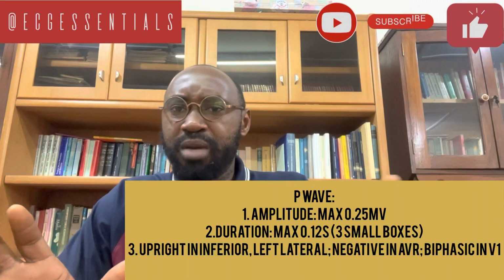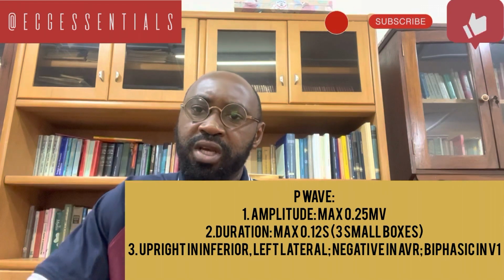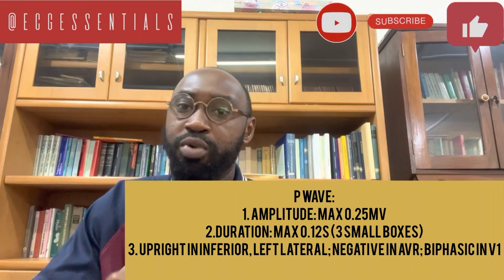All right, so a few things about the P waves help us to appreciate the rhythm, that is the origin of the rhythm, and also give us an idea, if they are absent, of a few possible causes of the absent P waves. We mentioned in our earlier discussions that the amplitude of the P wave usually does not exceed 0.25 millivolts in terms of the voltage.